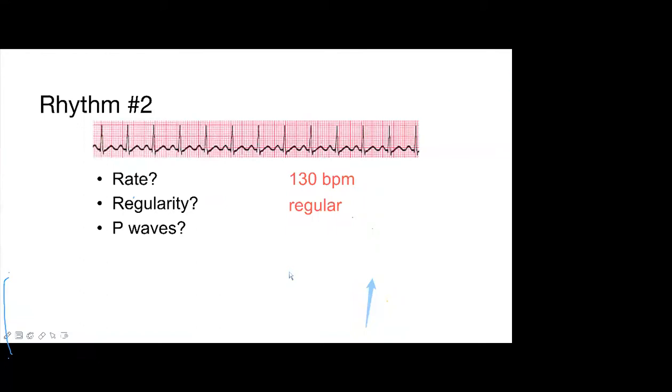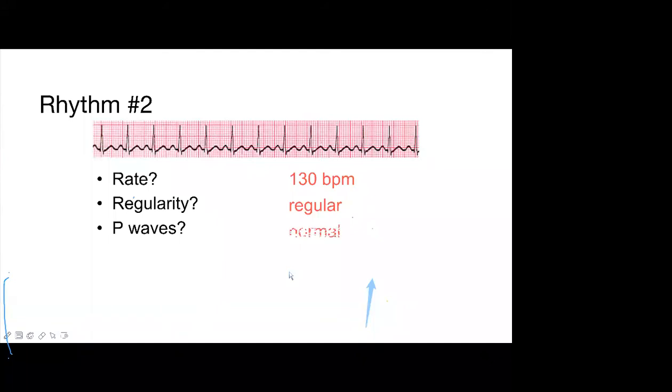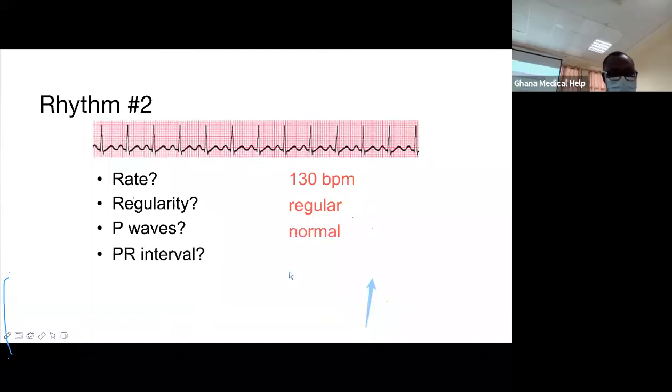Do we have P waves? Yes, there we have. Are they normal? Yeah, normal. Great. So we have a normal P wave. Let's go to the next one, the PR interval.